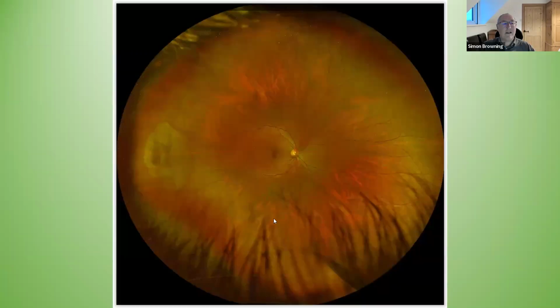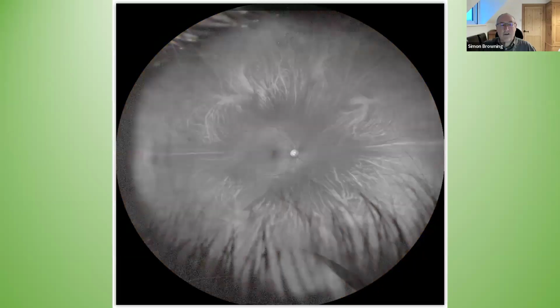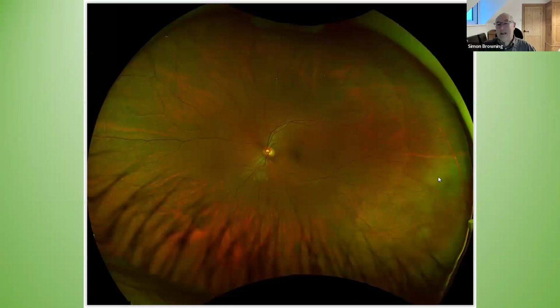But again, instead of just this diffuse around the edges, you'll often get these sort of discrete areas. And again, go back to the cling film on the kitchen surface. You see the sort of the margin around the white without pressure, where you've got the margin of traction going on there. This area here is actually called dark without pressure as well. So again, a very large area of white without pressure, but the margin or tide mark, as I've referred to it in the past, of dark without pressure.